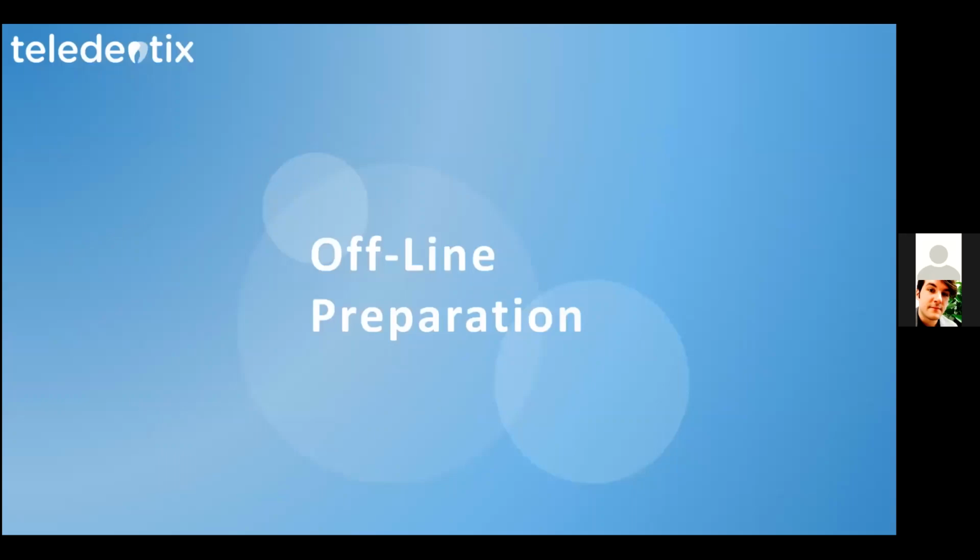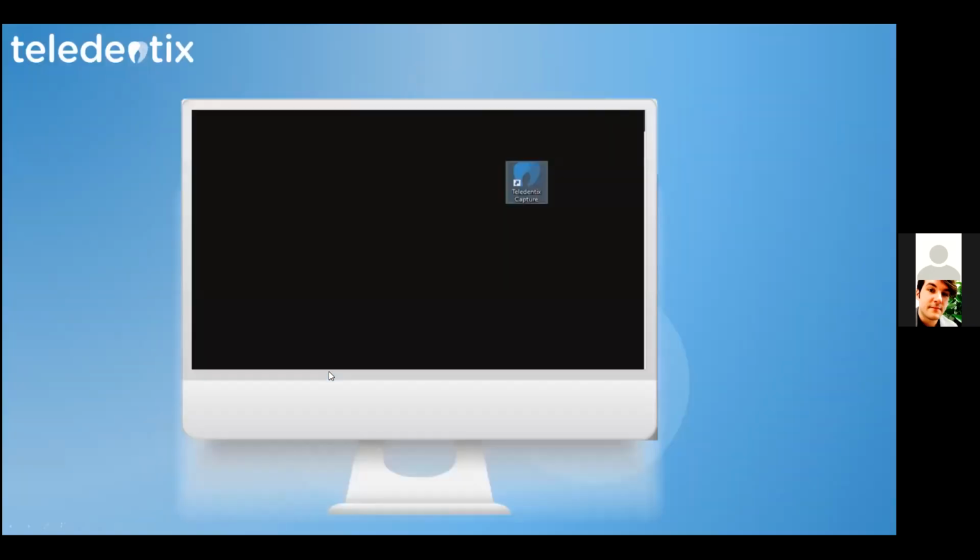Okay. So moving back into the capture here, let's go over the offline preparation. So let me just share my screen once again here. Okay, so offline preparation. There are some preparation steps that you need to take prior to using this amazing feature and of course going on site. So I'm going to go into my next screen here.